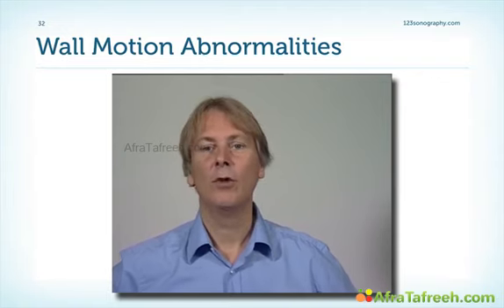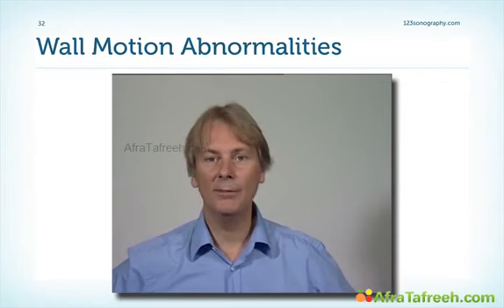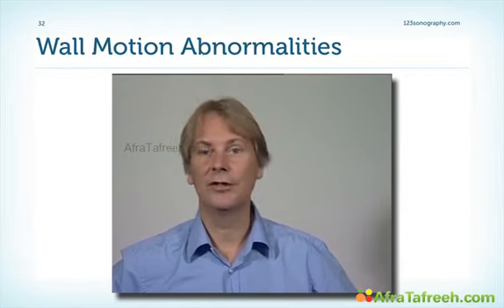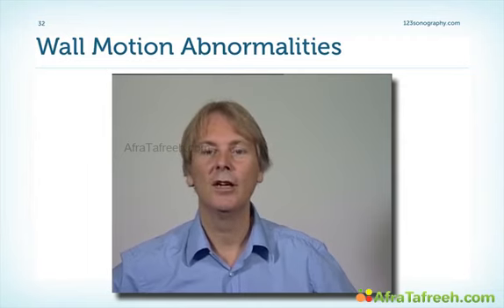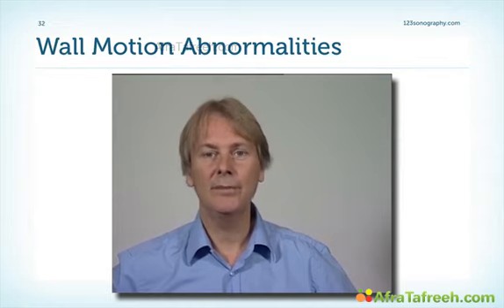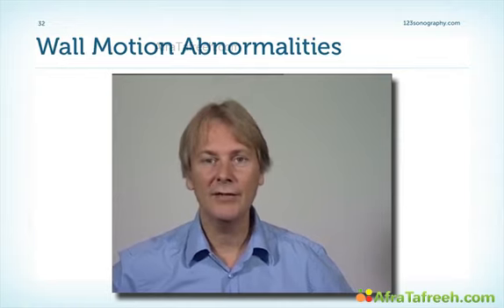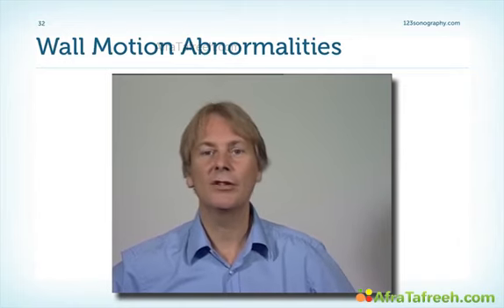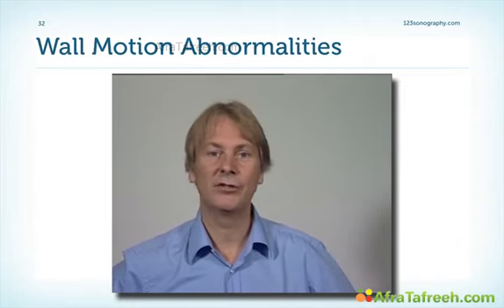So you see, wall motion abnormalities is a very complex issue. And keep in mind, it's not only hypo or whatever dyskinesia, but there's much, much more. Think of all the factors and about the physiology behind it. And very important, always put yourself in the driving seat of the referring physician and the patient, of course, to get the most out of the exam and to answer the questions which are relevant.